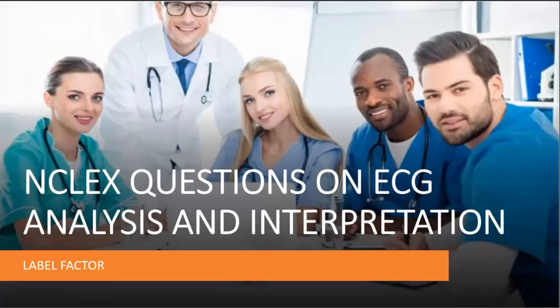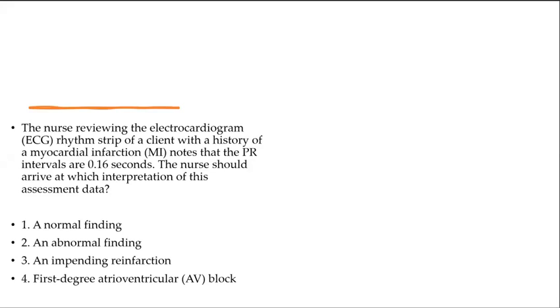Today we'll be looking at NCLEX questions on ECG analysis and interpretation. I'm going to advise, just because of time, that you pause the video to read the questions. I'm just going to be jumping into the answers so that we don't waste so much time running through the question. Again, pause the video and then unpause it to listen to the answer.